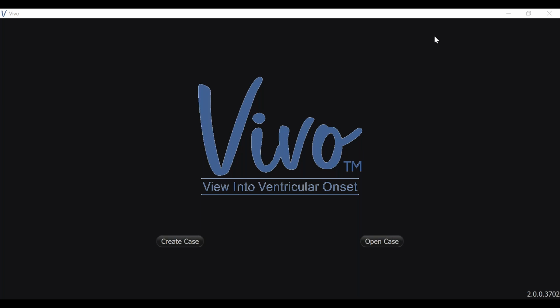Let's get started by double-clicking on the VIVO icon on your laptop. It should bring you to the home screen, which you see here. You see two choices, Create Case and Open Case. We'll start with Create a Case.